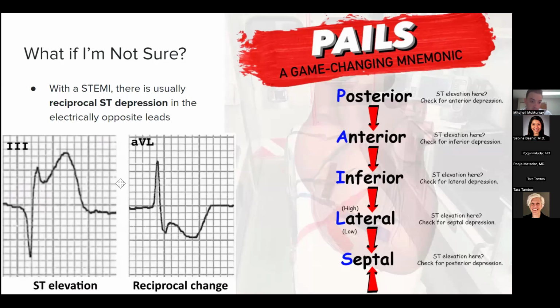It's like 5 small boxes, 5 millimeters of ST elevation. Then you go over, this is in lead 3, so lead AVL. You'll see that these are what we call ST depressions. You take your baseline from here, down, down, down, and your ST segment is depressed, and you've got a little bit of a T wave inversion there. That's super concerning for a heart attack.